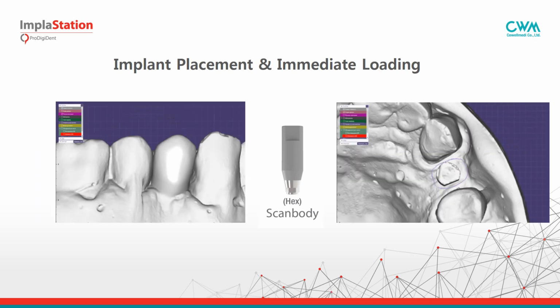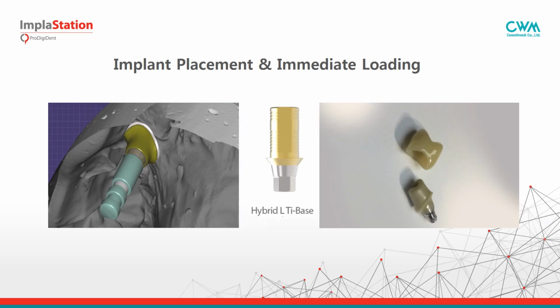Neighbor teeth help to create the crown shape, and the crown is deepened so the intersection line with the STL surface lies under the gingiva. The technician may indicate the abutment margin line. Then they should choose a titanium base for the hybrid abutment.